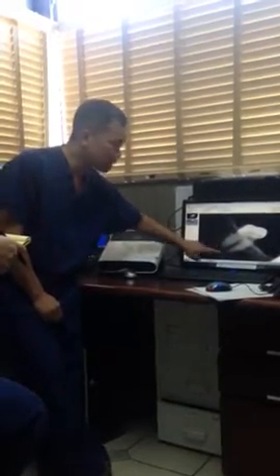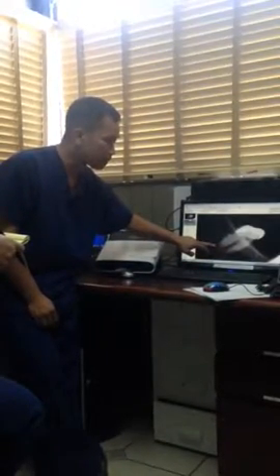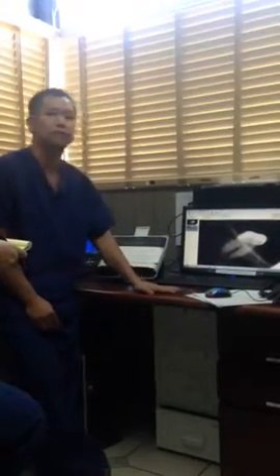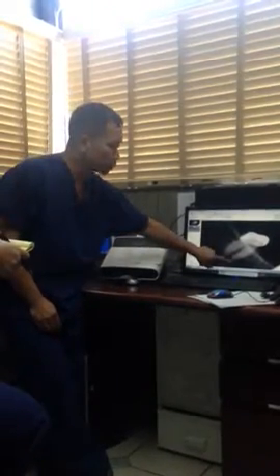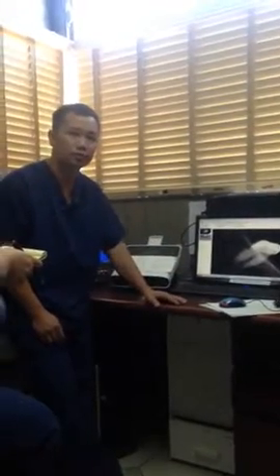Why can't I see the abscess here? Because the infection hasn't progressed to the point where it's dissolved this bone. Remember, bone is hard. It takes time for that bacteria to develop so much toxin to dissolve this hard bone. So you won't see that infection ball of pus that you would normally see on someone else's x-rays.